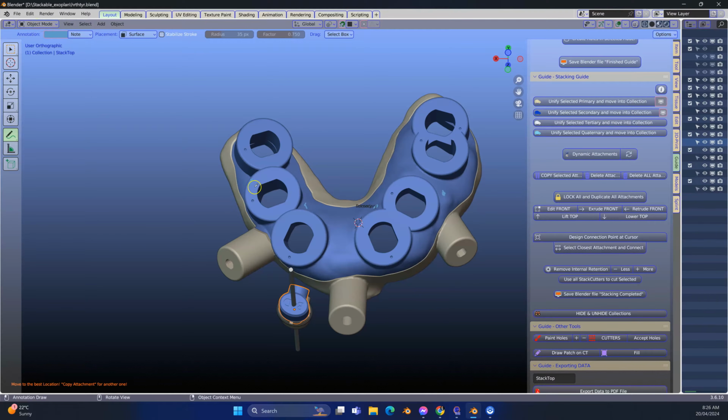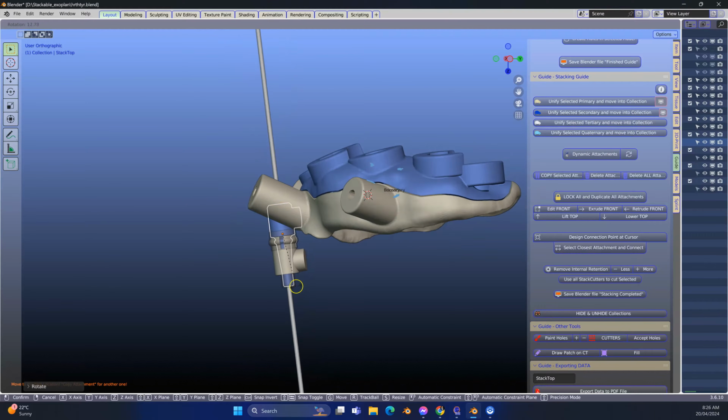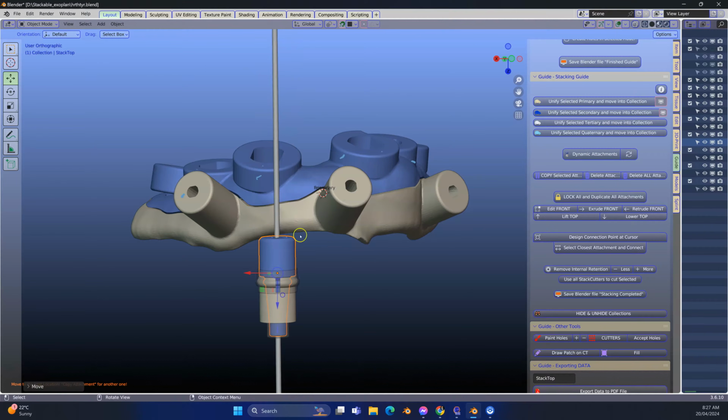I'll leave the annotation marks there, select this over here. Now you have to look at this, so from the front view using the R key and rotating it, we want to sort of lift it up and down into this direction, something like that. Okay, so you've got to be careful how you're going to do this, because we cannot change this later. It's going to be fixed. If it does that, the magnet tools are on. We don't want that on.